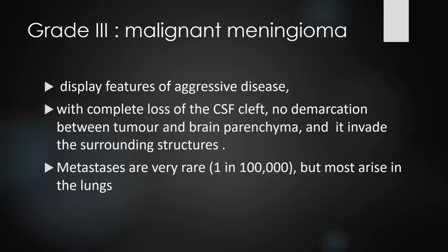Grade 3 or malignant meningioma displays features of aggressive disease with complete loss of CSF clefts, no demarcation between tumor and brain parenchyma, and it invades the surrounding structures. Metastases are very rare, but most arise in the lung.